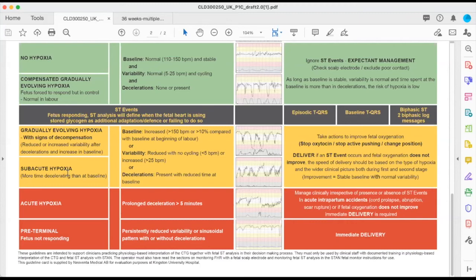We are left with the baby that's going through gradual hypoxia, was stable before, is showing ongoing stress at the moment, and is bordering between compensation and decompensation. So this is the baby that was showing hypoxic stresses before, and has now started to decompensate, started to redistribute, started to release the catecholamines, starting to use the extra resources.